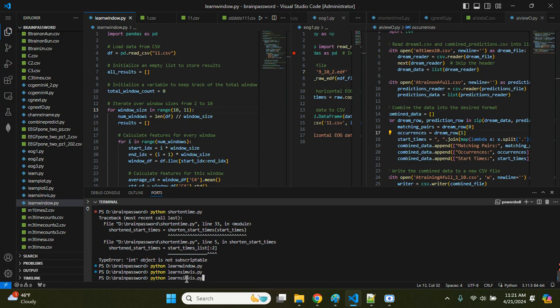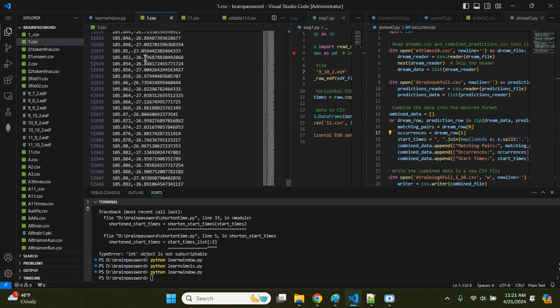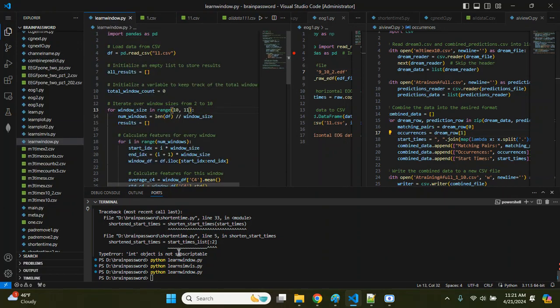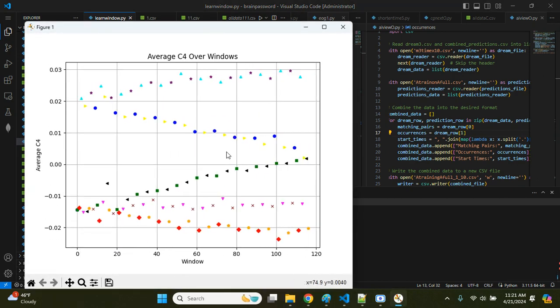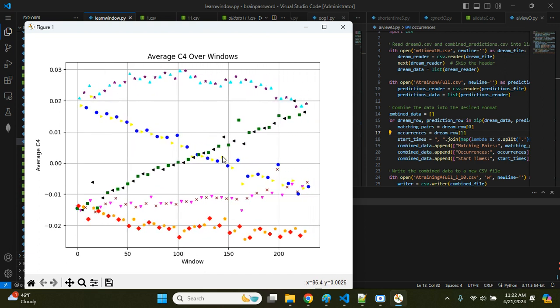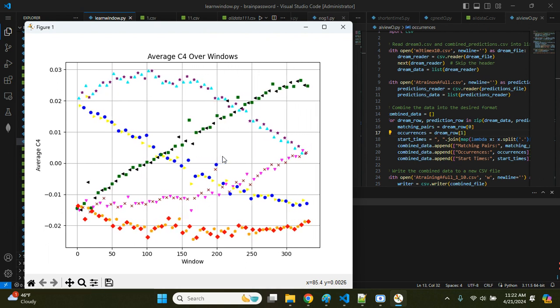So all I would need is the learn window, and I got the right data, right? I should have this data. Yeah, this is the right data. Learn window, then learn some viz again. And we should get, yeah, there we go. And this was where our visual just represented the 10 steps perfectly.